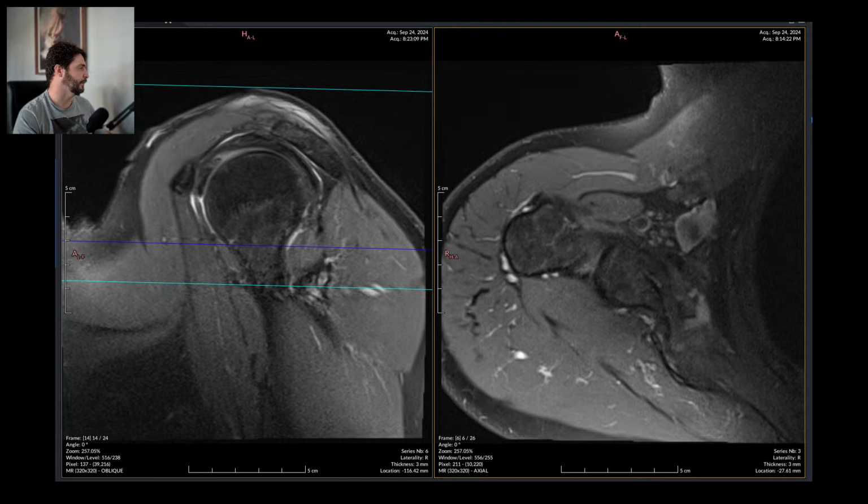Shoulder. Let's get the shoulder. I have a template for a shoulder with disease, so we can type it faster. Well, the scapula has signs of old fractures and some deformities.